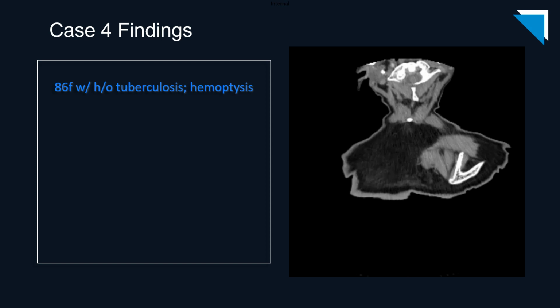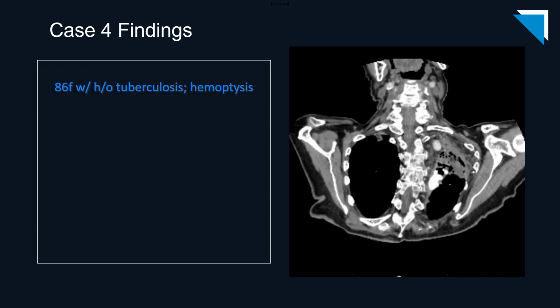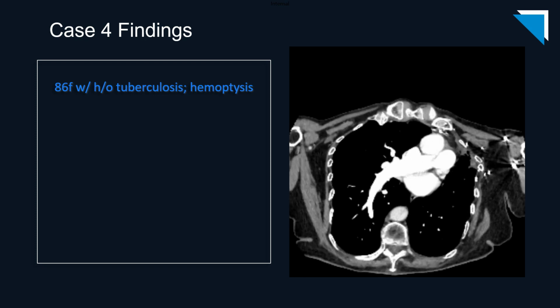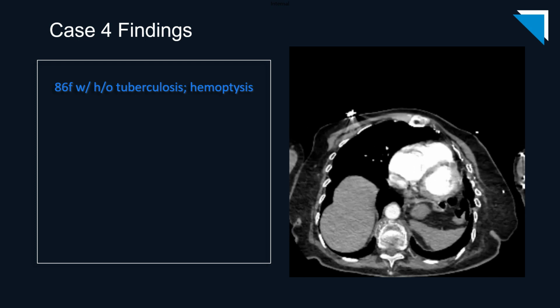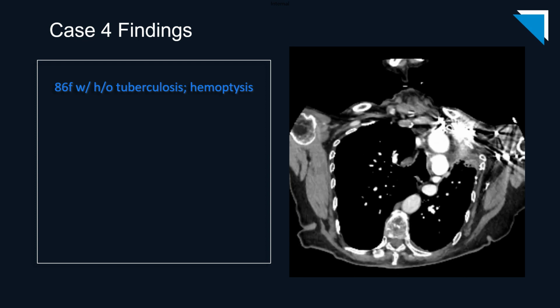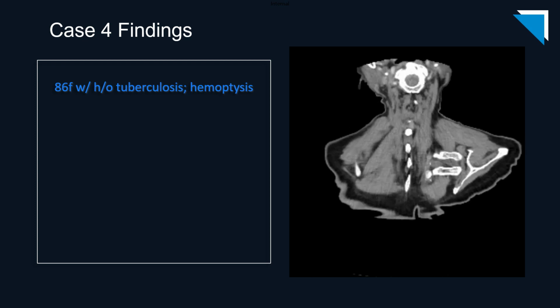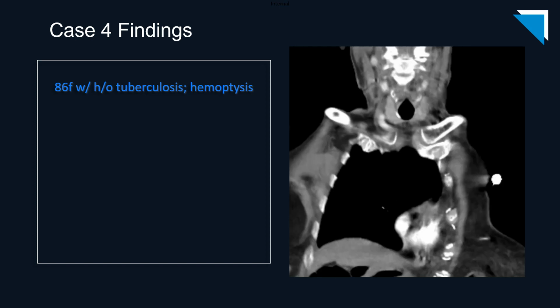Let's have a look at the axial images from a CT angiogram of the chest, and the coronal images from the same study.